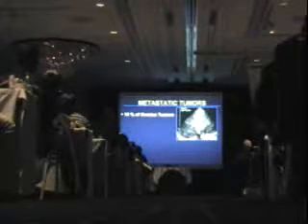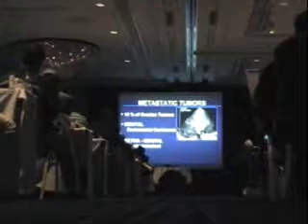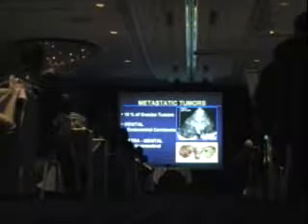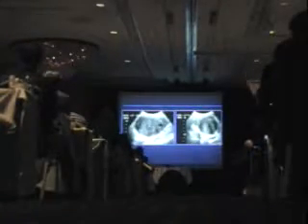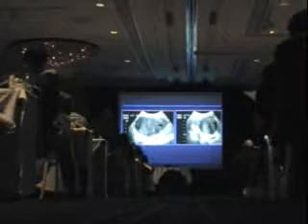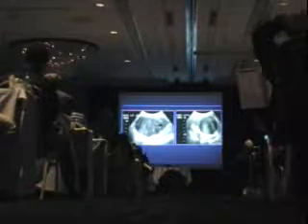Metastatic tumors are often solid and bilateral. If it comes from the GI tract, we call it a Krukenberg tumor. Dr. Netter agrees. They're often more solid than the primary tumors that we see in the ovary. And sometimes you'll see a solid mass, as we see here. Notice the shadowing.